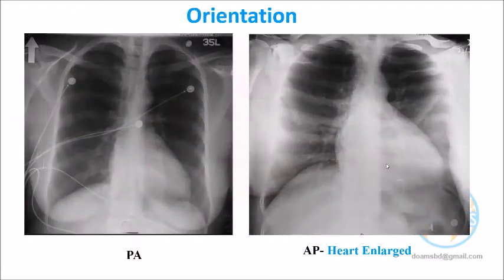Now come to the picture of orientation. This one and this one. What are we looking at on the right side? Dr. Rashid.